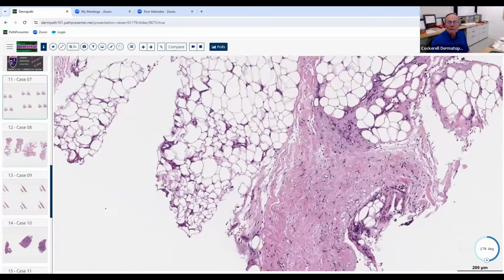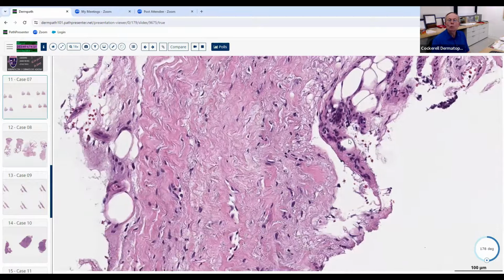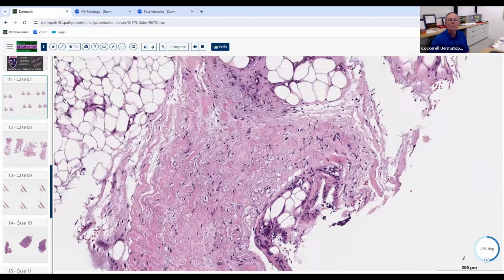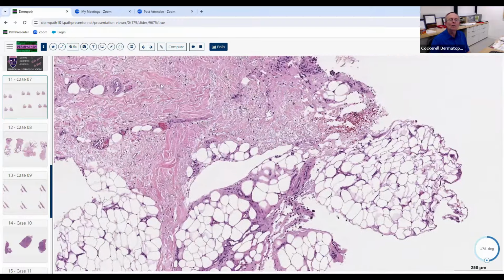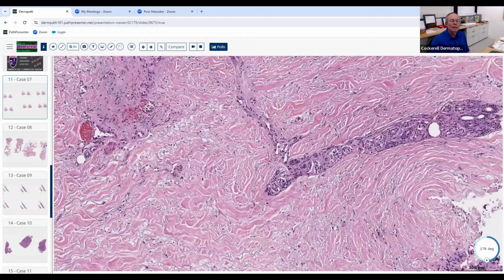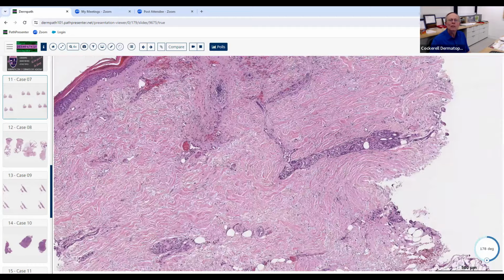Calciphylaxis can do this. And sometimes when you see calciphylaxis, the amount of calcification is really subtle. You see just tiny little flecks of calcium, little teensy tiny bits like that, and the actual thrombotic blood vessels may be subtle because it may be a deeper blood vessel, and all the stuff downstream of it is what you can see. And it may be really subtle to see the blood vessels. It's kind of difficult to see in this case here.